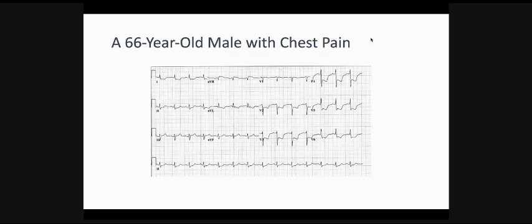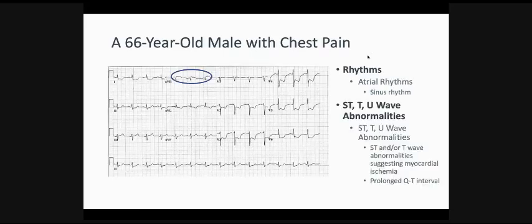So let's see the answers quickly before going. Perfect. Excellent, mashallah. Yeah, you got this right. All right. So most of you got this right. So the trick here is that you should code a sinus rhythm as well.